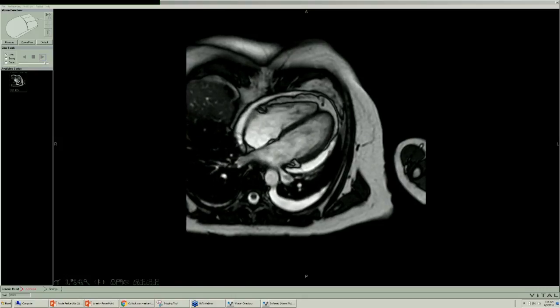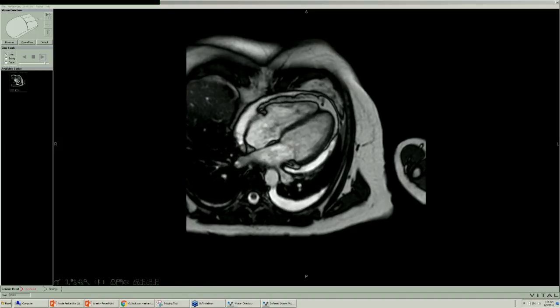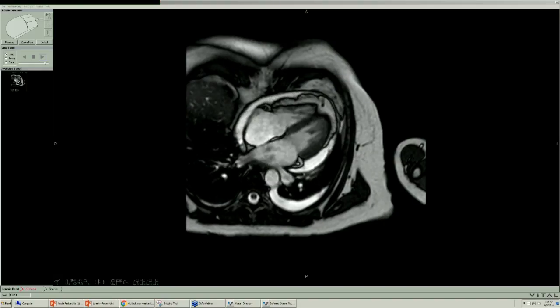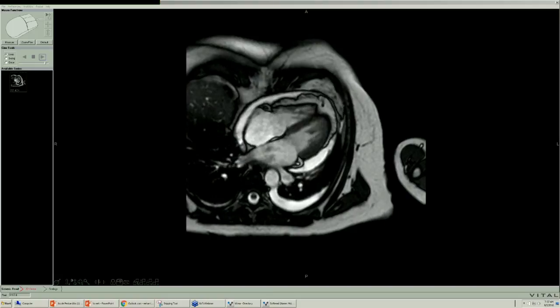There's fat around the heart, which is where the epicardium is, and the epicardial coronary vessels are embedded in the fat. And then there's a parietal pericardium and then a visceral pericardium, and then there's the sac. So you can see this very well. You can see the heart is doing the backstroke. So we'll show you a couple more images.